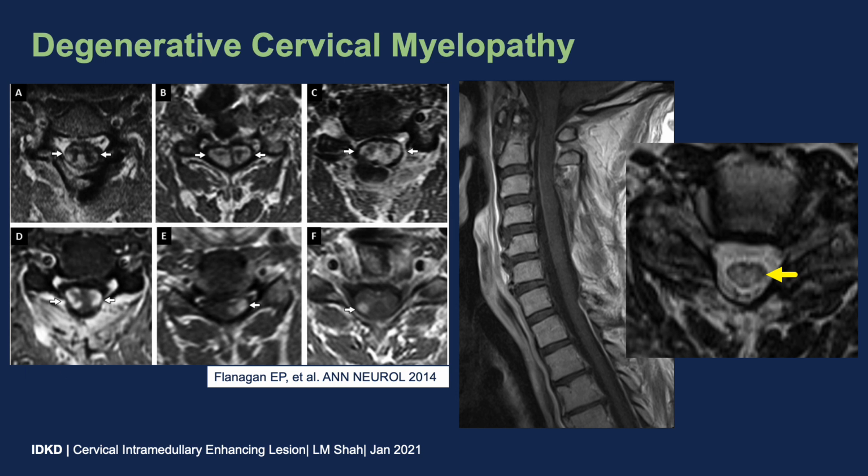The typical pattern is circumferential, sparing the gray matter, although there may be a spectrum of findings such as involvement of only the hemicord or single focus of enhancement. The enhancement can resolve after surgical decompression, as noted on the post-contrast sagittal image on the right. The intramedullary T2 hyperintensity can persist for several months after surgery.